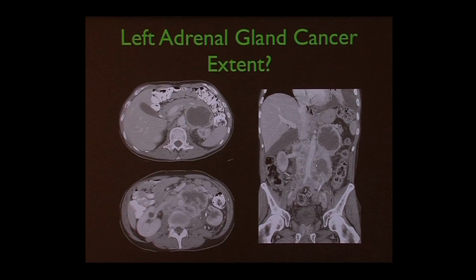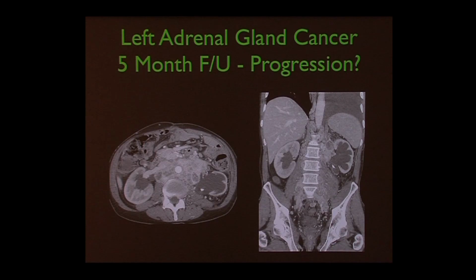So this is bad news, but they treated the patient, and he comes back for a follow-up to see if it's getting worse or getting better. Unfortunately now, he's got obstruction on both sides. This is the obstructed left kidney with just a little thin rim of the kidney, and this is the urine in the obstructed part. And now the other side's obstructed as well, and the tumor has gotten bigger.